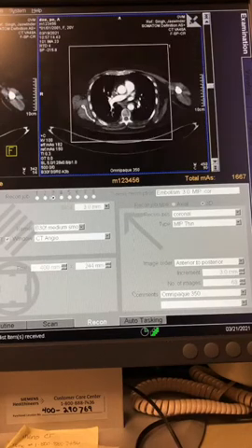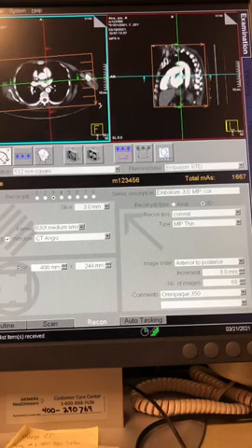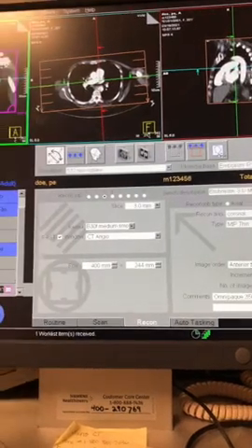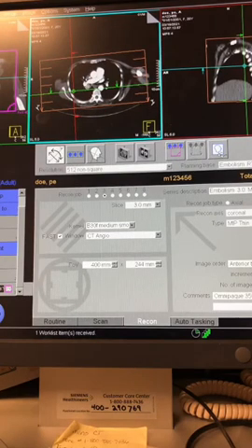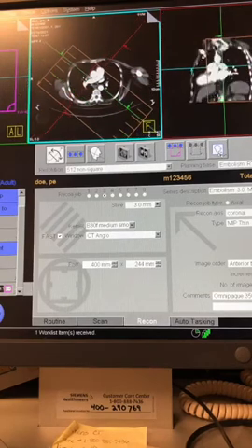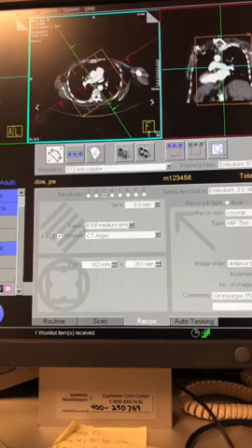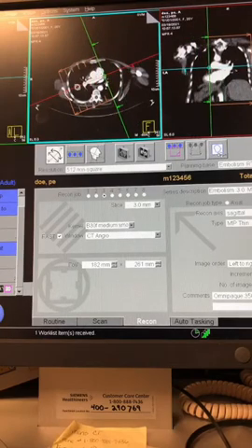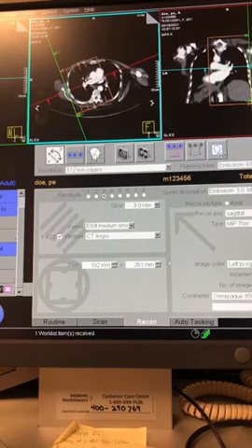Let's go ahead and jump into this here. A lot of facilities do different things. For instance, if we look at this center slice right here, this is the right pulmonary trunk, so we could do a cool reconstruction through there. These are called obliques. If I zoom in a little with my field of view, I'm going to align the axis straight through that pulmonary trunk, going from the trunk through that whole right lung, so we're able to follow it down. It's going to stand on end.